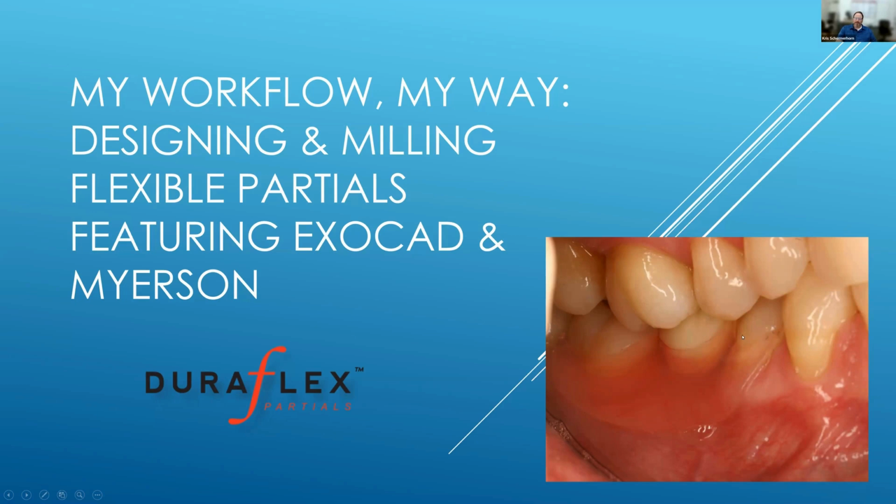You can see also aesthetically, they're really nice. This is a Nesbit here, and you can kind of see how it blends in. The translucency allows it to really, even in this extreme close-up, make it hard to recognize where the partial starts and stops.